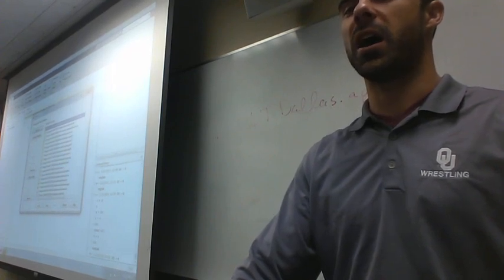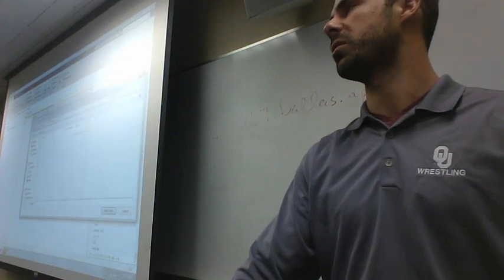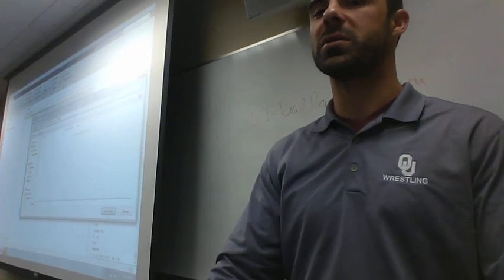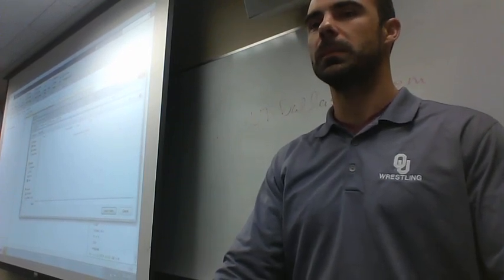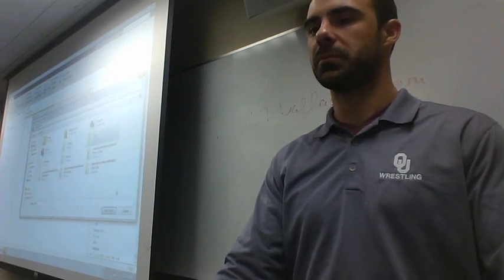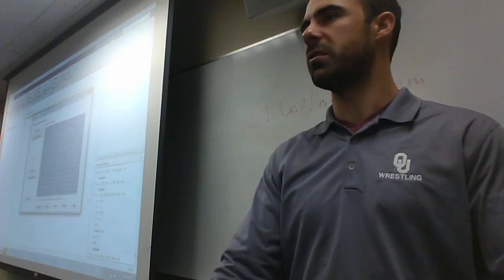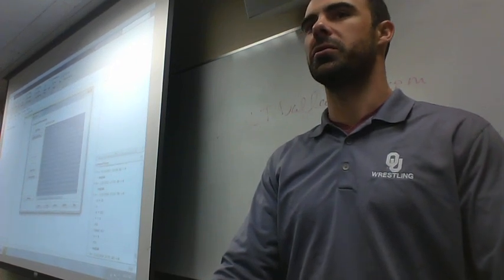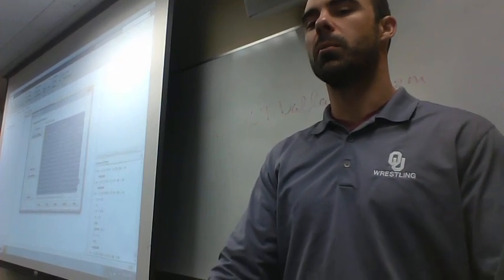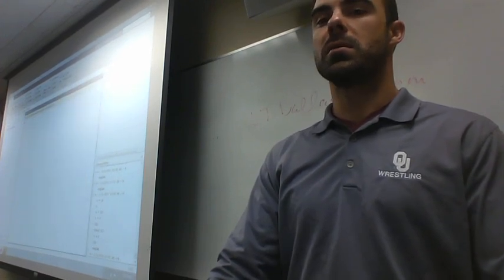Within set path, we want to add with subfolders. With subfolders, it doesn't just add that one place we want it to look, but it includes everything within that spot that we select. Anybody remember what we select? Yeah, we came up here and we just selected our EEG folder. We don't hit save because our administrator rights on these computers are goofy. If you have it at home, then you can hit save and you don't have to do this again. But for now, we just hit close. It'll ask us, do we want to save it? And we say no.